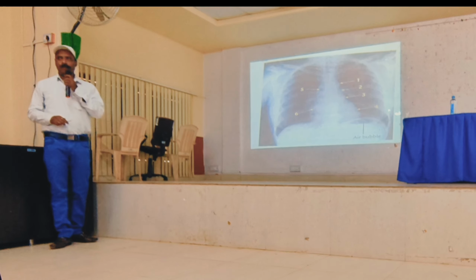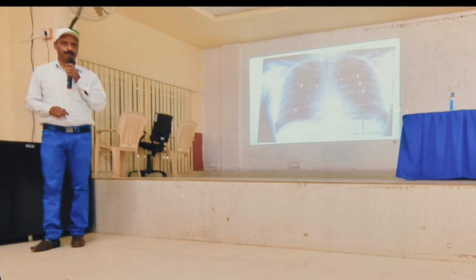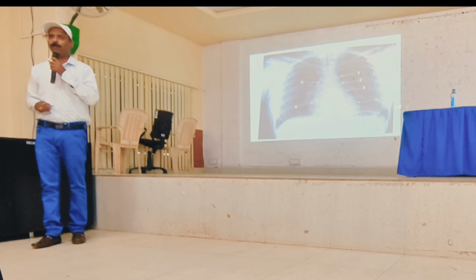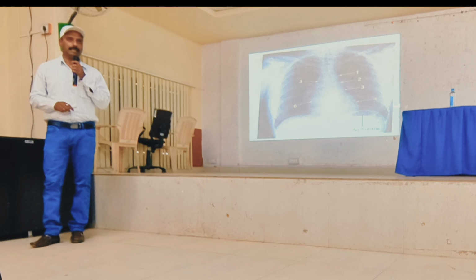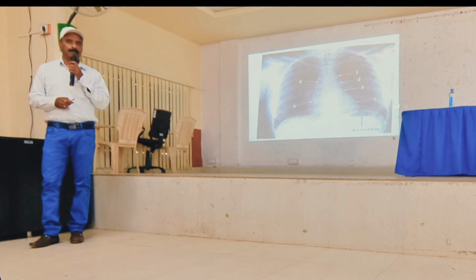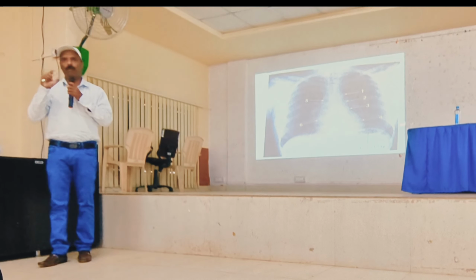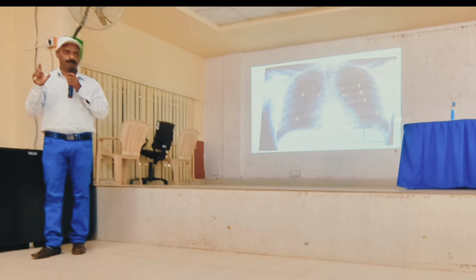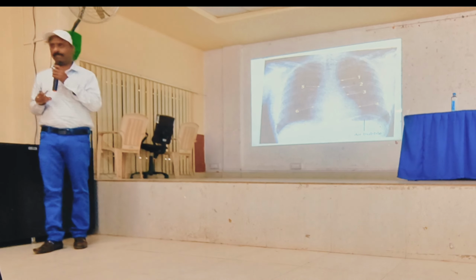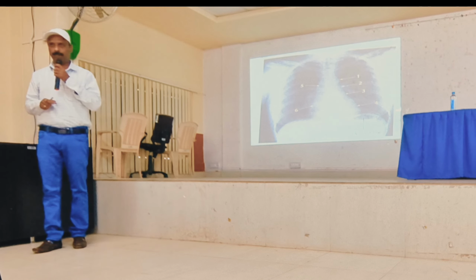So this is an X-ray brought by the patient to you. What are you going to observe, or if it is kept for spotting, how are you going to comment on this particular X-ray, or when you are going to write about the X-ray? In the first year, first think of whatever is normal. Don't go for any abnormal comment in the exam at least, unless and until it is highlighted by the examiners.